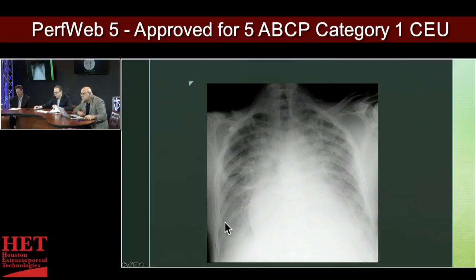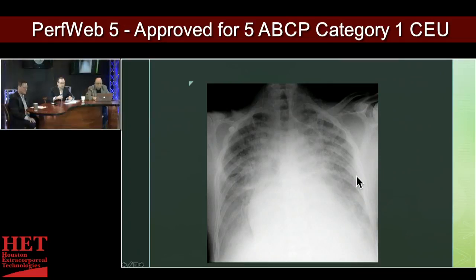You don't see large pleural effusions, which oftentimes CHF patients will have, but in an acute vascular congestion situation, they may not have developed yet. So you're exactly right. You can see that the trachea is midline. You can see the right main stem. You can see the left main stem here. And then you can see these hard white lines right through here. Could be fluid that's beginning to accumulate in the fissures of the lung as well.